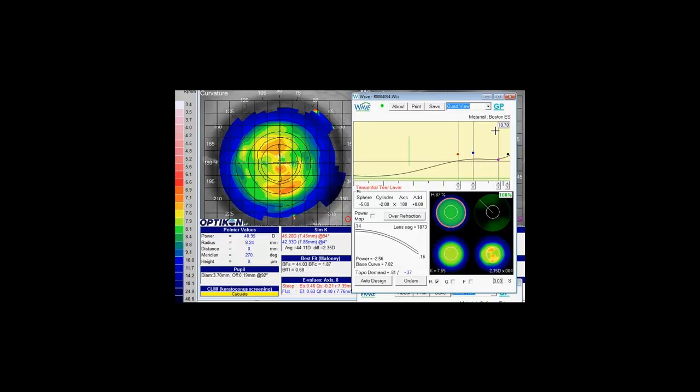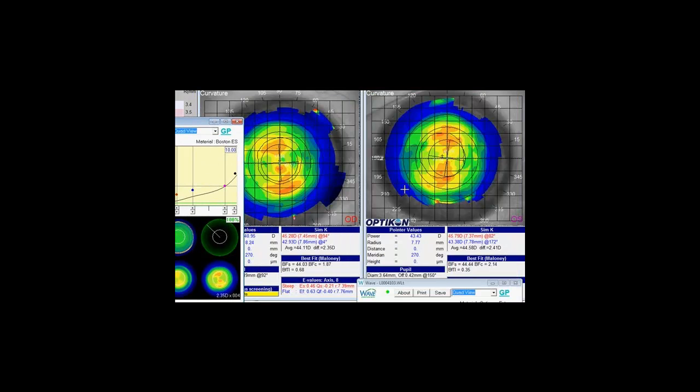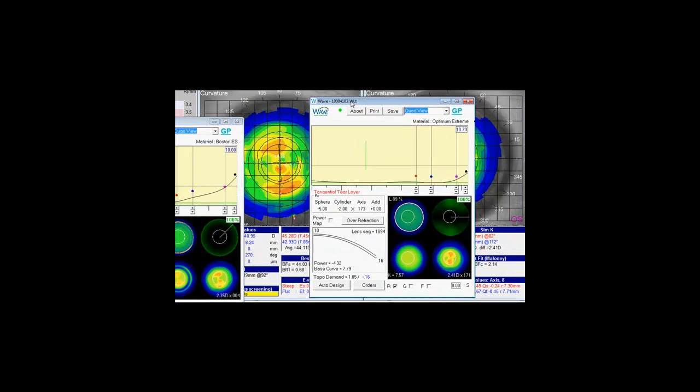So what you're going to see is a simple 7-step process that we use to design pretty much any contact lens we might want. We first change the diameter, then the design mode, size of the optic zone, placement in the intermediate curves, switch a few things, and let the software do its thing. That right lens is complete. After analyzing the left topography, we'll make the same changes.